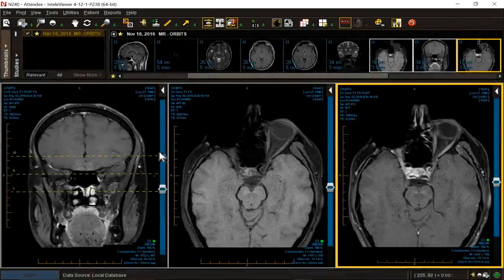So when you have this type of movement of a tumor that is ill-defined or irregular or kind of weaving its way around, and it's going from anterior to posterior, usually you're getting into the cavernous sinus, which we are, through the foramen rotundum. I'm going to show you through the foramen rotundum.